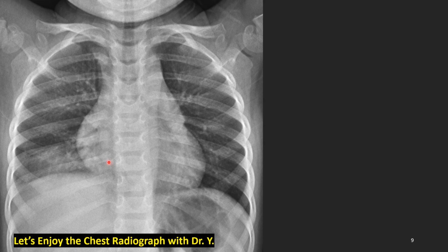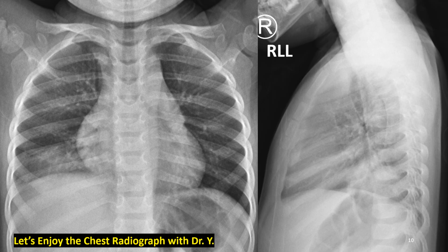Are you confident about silhouette sign? If not, please go back and review again session 2 and session 6. Let's imagine the next image of lateral film. How about this lateral film? Was this concur with your idea? Yes? Good job.